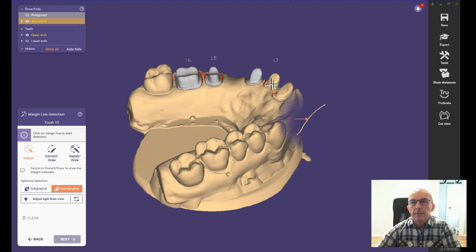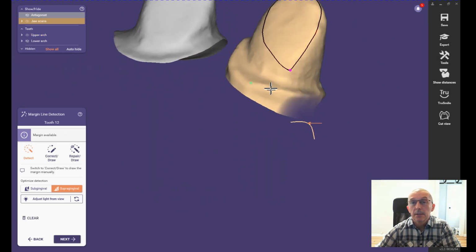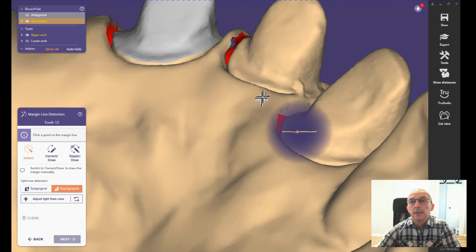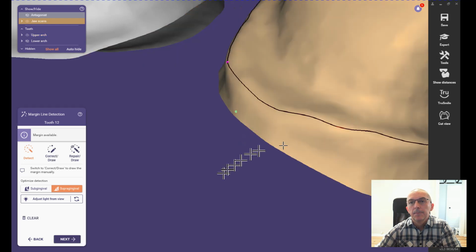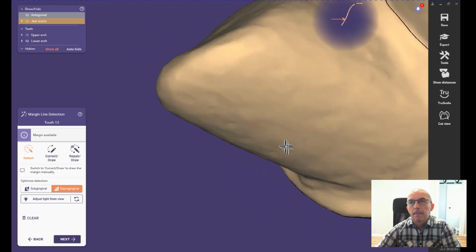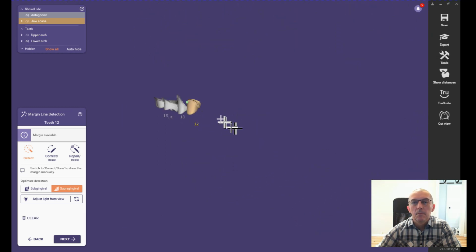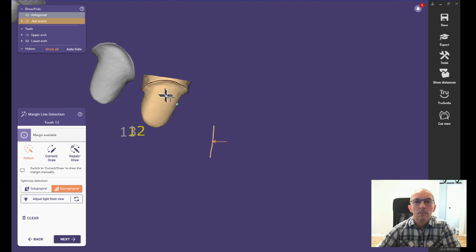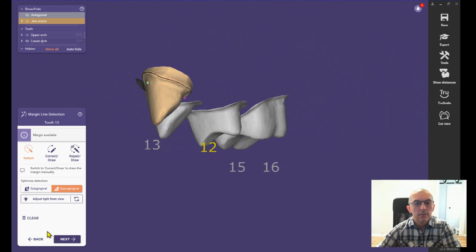So we'll go here. No, you don't want to click on there. Let's clear it. We're going to just go right about here. Okay, that looks good.